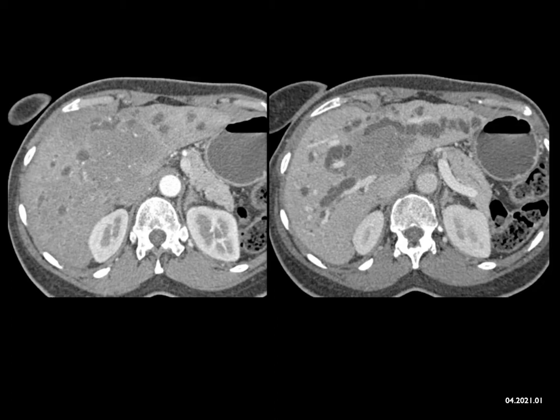Well, it could be a cholangiocarcinoma because cholangiocarcinomas can be bulky, infiltrative tumors, and they do commonly cause duct dilatation, and that's as opposed to hepatoma, which can be a large mass like this, but again, we would typically expect it to be more vascular in about 85% of cases, but also you really don't see duct dilatation.